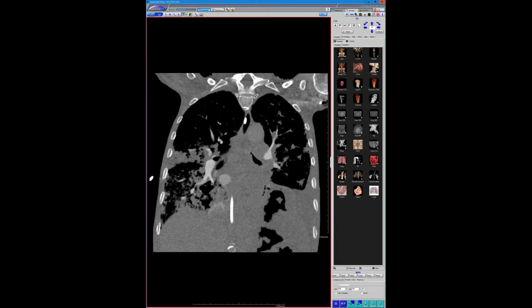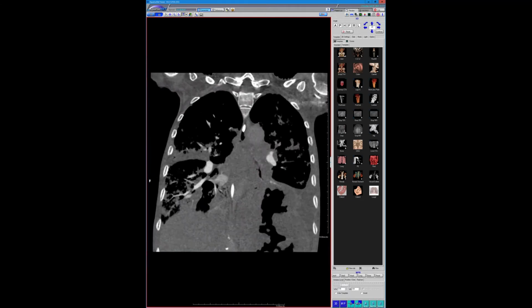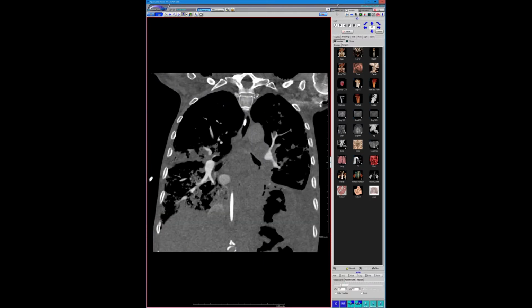And I don't know how she's not hemorrhaging everywhere, but I guess this has been known for some time. I mean, I've seen lung cancers eat into a lot of things. I've just never seen it go into the spleen before. So I thought that was really weird. Wow.